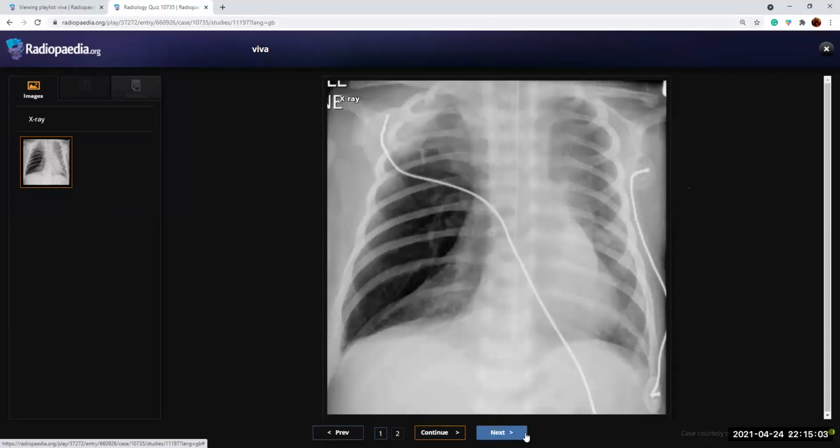This is a young child with respiratory distress, maybe a month old or so. Okay, I'm provided with a frontal chest radiograph of a skeletally immature patient who complains of respiratory distress. The first abnormality that I can see is volume loss of the left hemithorax. There's a tube placed in the midline which appears to be located quite proximally, probably at the gastroesophageal junction. I would like to confirm whether a nasogastric tube was placed or not.